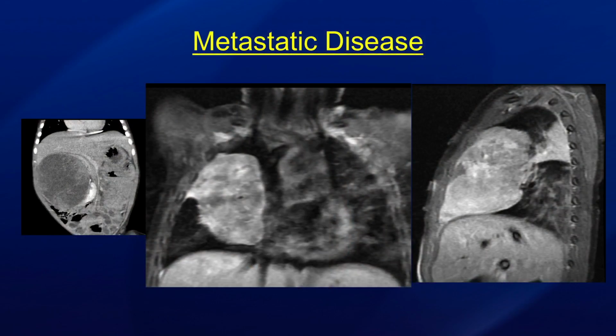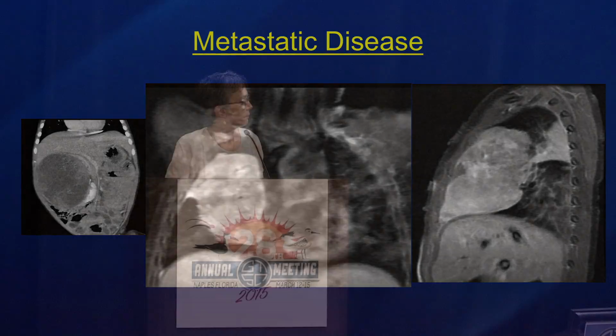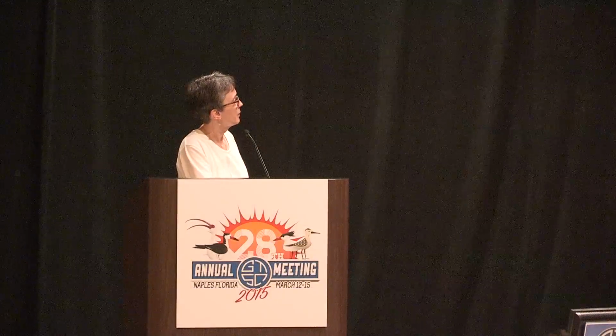So this is a very interesting case of a one-year-old child who had a mesoblastic nephroma in the right kidney, and those are usually things where they present near birth, you resect them, and they do fine for life, and never have a recurrence. And this child actually showed up 8 months later with this large right upper lobe mass, very vascular with a lot of enhancement. The MR really showed it well. It abutted the fissures, abutted the mediastinum, and that was a metastatic mesoblastic nephroma, which is kind of an amazing case. But they didn't do a chest CT on him.